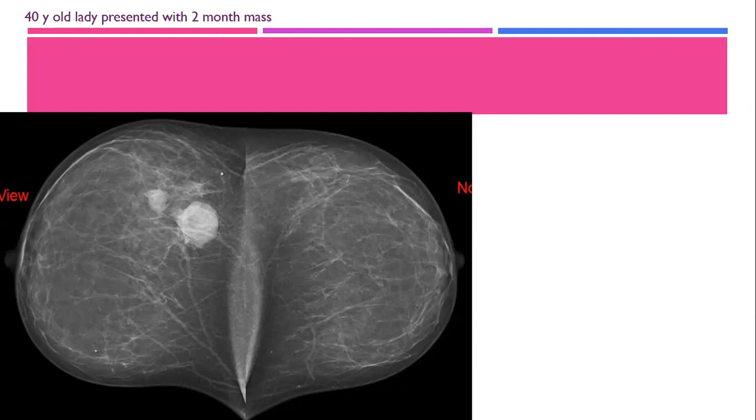is well circumscribed, in the most posterior part of the breast. Posterior part of the medial, lateral, or central? The posterior part of the lateral. Excellent, well done, Abir.